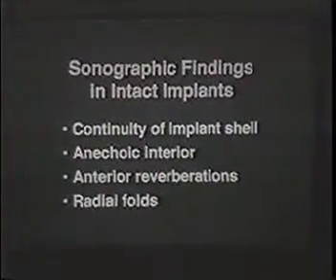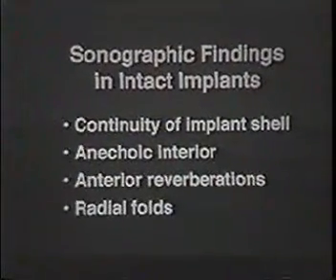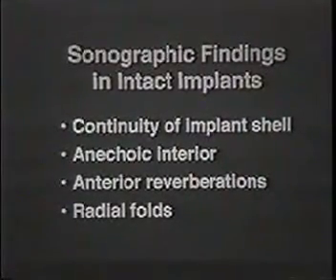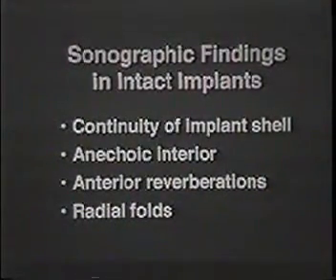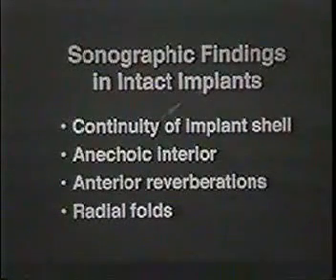Another use that we found for sonography is the evaluation of implants. Silicone implants. Many women come with problems associated with their silicone implants or symptoms, referred to us by our plastic surgeons or other clinicians. And we've learned that there are certain findings that are associated with an intact or ruptured implant. And many of these here are from the literature.